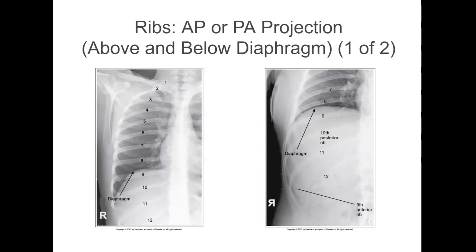Image analysis guidelines for the ribs state that the thoracic vertebra to the rib head articulations are demonstrated. The medial clavicular end is adjacent to the lateral edge of the vertebral column. Distances from the spinous processes to the pedicles on each side, when seen, are equal. The jaw and scapula are outside the lung field.